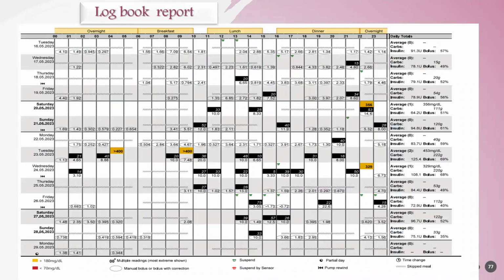And as we said before, in the setting of follow-up of the pump, we need to test the basal by asking patients to fast at specific times. Although the patients can cooperate to do it, or you can grasp this information from the lab reports which you have by yourself. You will just try to find the times when the patients have only basal, without carbs and without giving corrections. This will be the easiest method, to go overnight. So here overnight, the pump keeps giving correction boluses all night. That means the basal of that segment is not good.